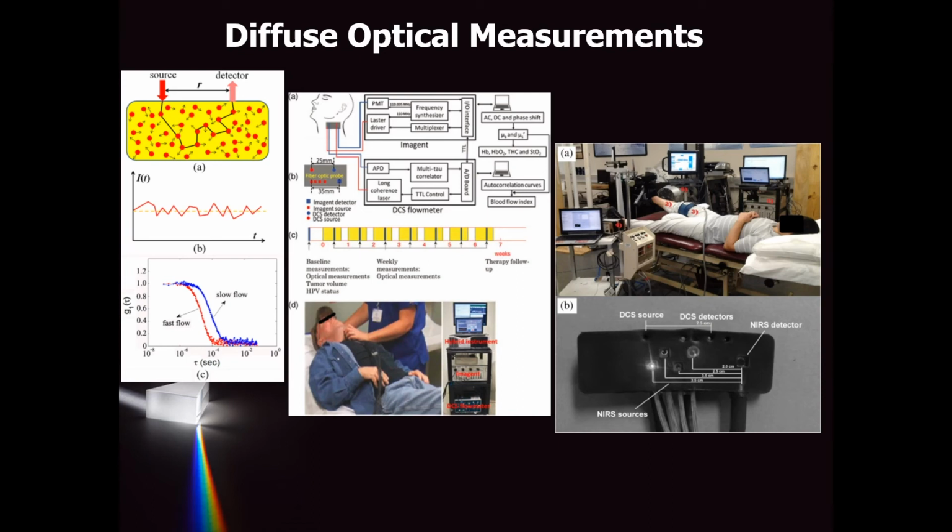If you measure this signal and you take the G1 of the curve, which is basically the normalized autocorrelation of that, what you get is the G1 curve. And that's what we measure here. So we are going to measure this curve by measuring these intensity fluctuations.